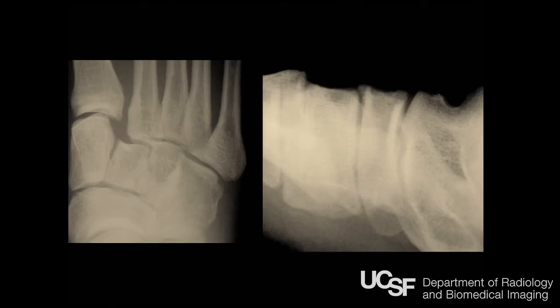When you're looking at the Lisfranc joint, a couple of things. These bones should perfectly align. So the second metatarsal should perfectly align with the central cuneiform, or second cuneiform. On the lateral radiograph, the metatarsals should never, ever be dorsal to their respective cuneiforms. If they are, there's something wrong. If you have doubt, if they say they have midfoot pain and we think there's something going on there, get weight-bearing views with the contralateral foot and look at the differences.